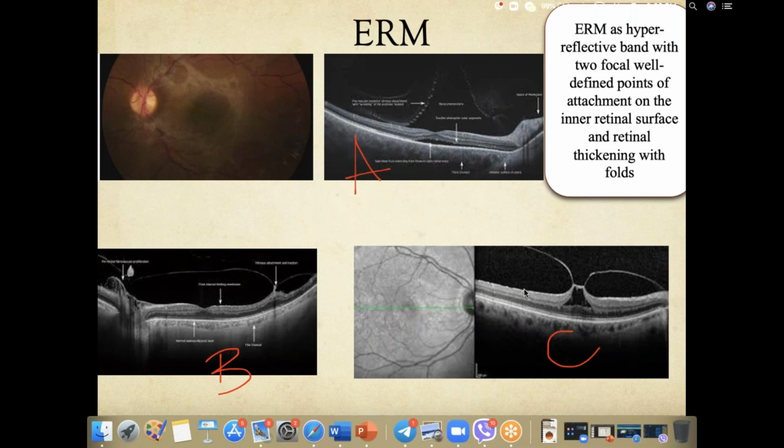All right, C, yes. Because it's in the macula, right in the fovea, it can snap off the central vision, and it can cause a macular hole. Over here, traction is present. In this eye, the risk is that if the traction is too much, it might just rip off the retina over here, create a break, and this can go into a retinal detachment. Do you understand? So this can actually occur as well.